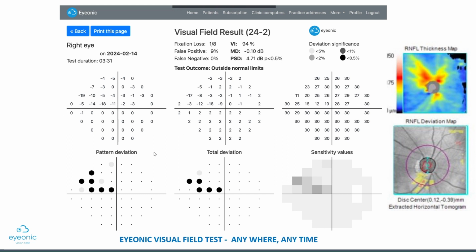And that's why, moving from total deviation to pattern deviation, we subtract out all the global defects. That global change is actually a -2. So you can see all these points here are 2 above what we expect. They've moved to 0, while the point that was -16 has moved to -18, and the point that was -2 has moved to -4. And then we ask the same question again, is that difference significant?